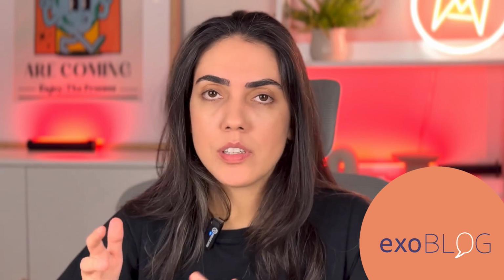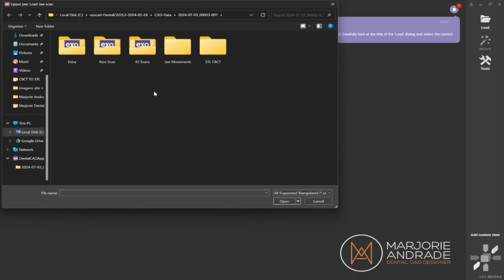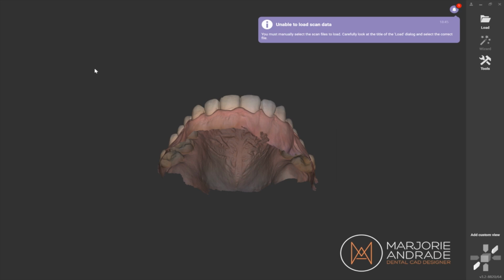And today I want to share with you some of my favorite things about exocad. Not only does the software give you freedom to go back and forth in the project in expert mode, but you can also add as many extra meshes as you want. And that's very easy to do. Here, for example, I have my own case to show you.